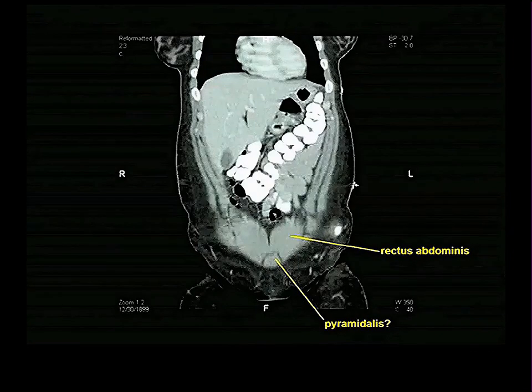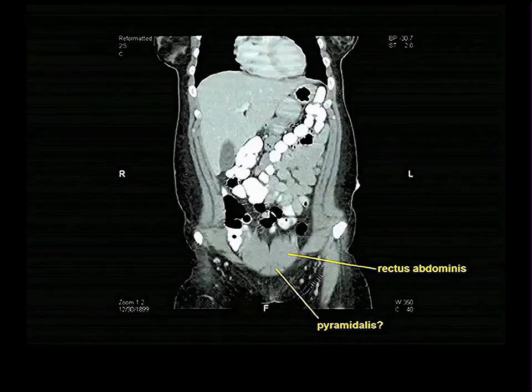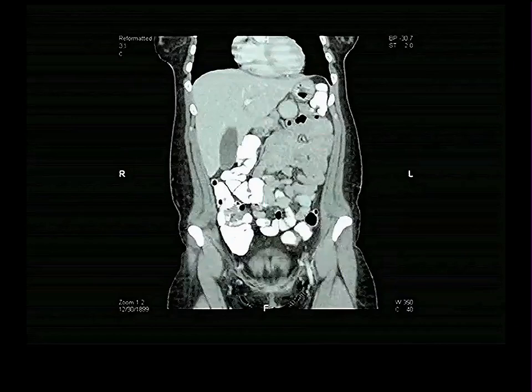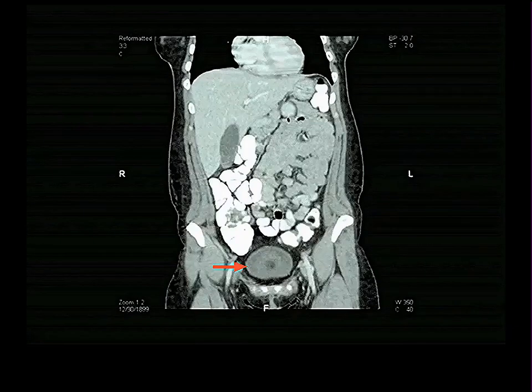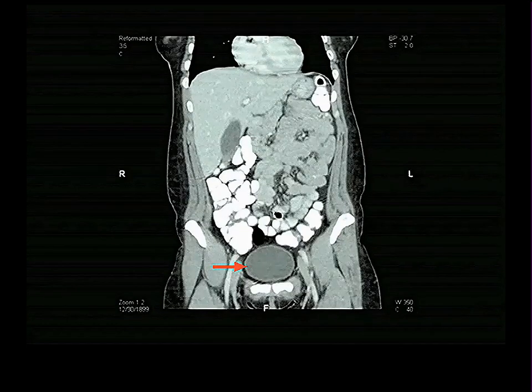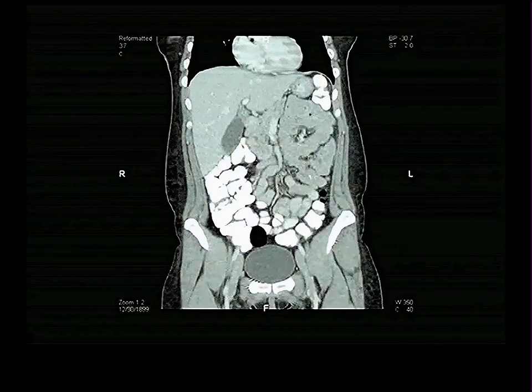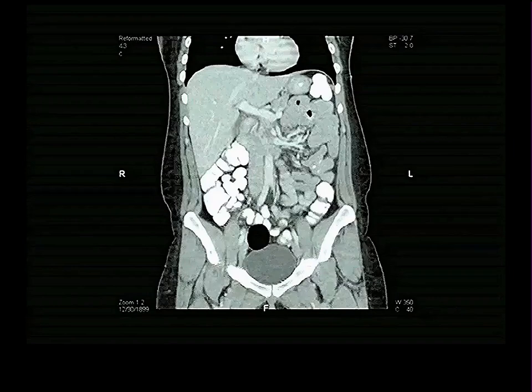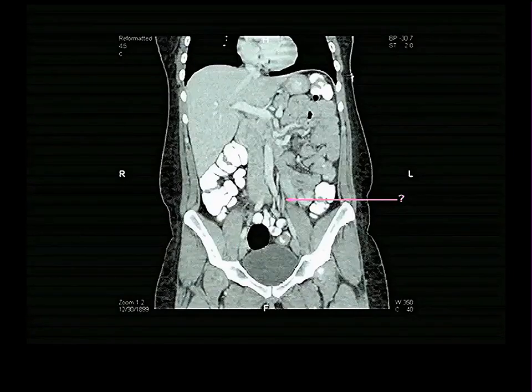So we're going further backwards. I'm not going to go through most of the stuff. Of course, the first thing we come to is the bladder. Once you're behind the abdominal wall, you come to this woman's bladder. Keep on going backwards. After the bladder, we expect there to be a uterus as we go backwards. We'd like there to be a uterus.